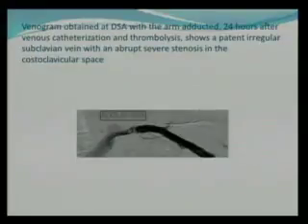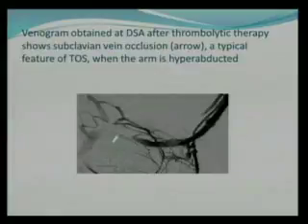After you have done the thrombolysis and you have successfully recanalized the venous segment, because now the bridging collaterals are no longer seen, you still see that there is this distinct shelf-like defect at the costoclavicular space, which is this. And classically, when there is impingement, the defect is called shelf-like. It's like one plane, just like a little shelf over here. This is in adduction, in neutral position, in normal position.